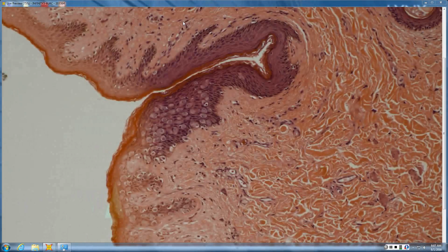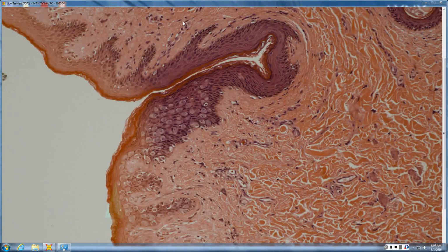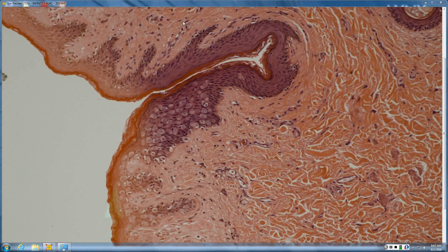So, stain not perfect, and I used to throw out every slide with an imperfect stain. The problem is that real life has lots of imperfect stains, so that is within your scope of practice, so it is tested to look at less than perfect stains because that's a measure of your competence to practice. So I keep some of them in now.